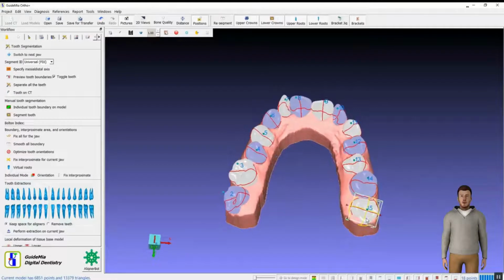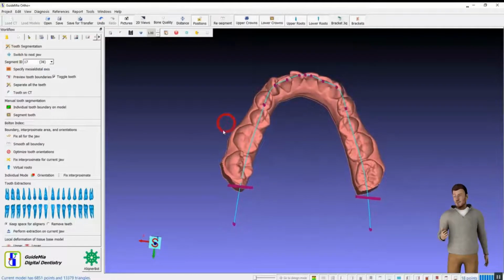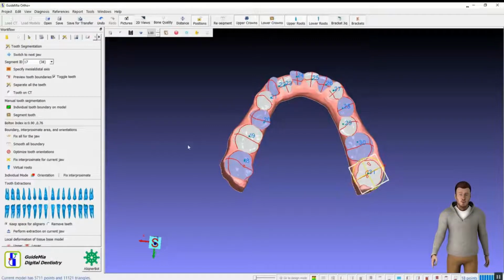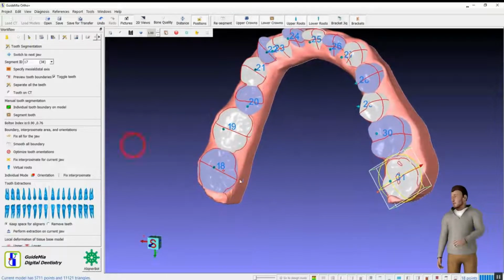After the tooth segmentation, we want to segment the roots from CT data. Clicking the button, we enter the segmentation mode. In this view, we see the axial view, where you can use the left mouse button to adjust the thresholds. The assembly view has an area of the CT data surrounding the tooth. We can rotate the view and change thresholds.